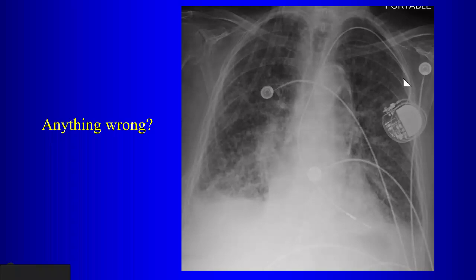So, as you follow this, where should this be going? It should go from here into where? It should go into the subclavian what? Vein. Vein? And then where should it go? SVC, and then where should it go? Right atrium, and then where should it go? Right ventricle. Is that what you see, or is there something that's troubling you?